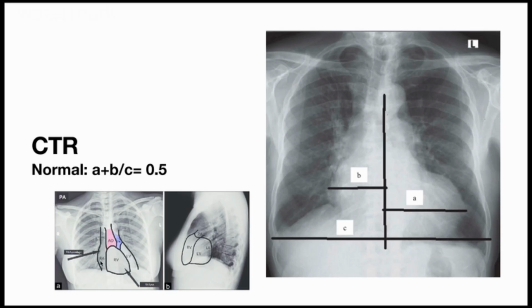On the lateral side, we have the right atrium, and posterior to the cardiac shadow, we have the left atrium. As shown on the lateral view, usually we have it more systematic like that: right ventricle, left ventricle. So it's very important that we know this; it makes it quite quick.